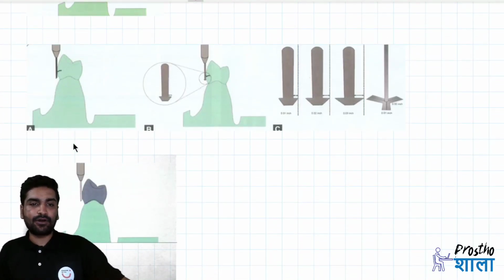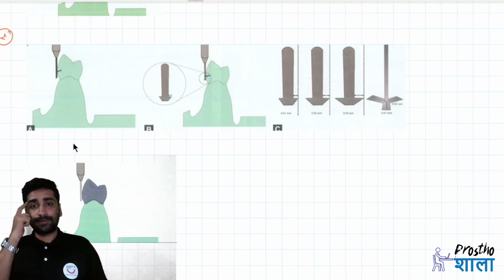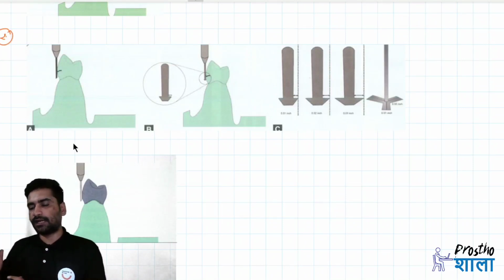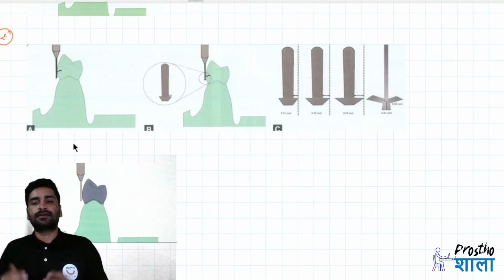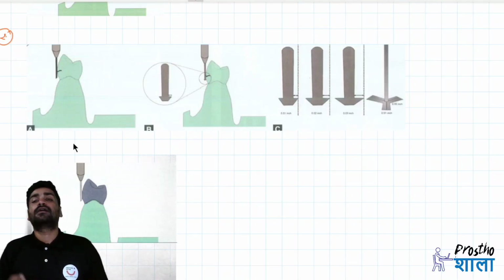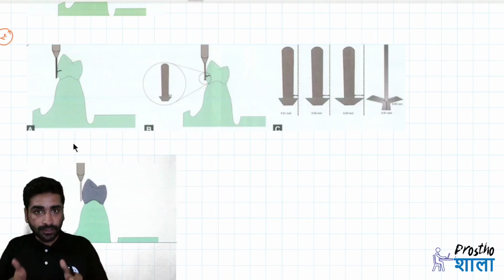The second important tool over here. Now you have analyzed. The picture is in your mind: on this premolar this much undercut, on this side premolar this much undercut, in this area the tooth is more inclined, so there it might affect. But how do you bring that picture onto the cast?